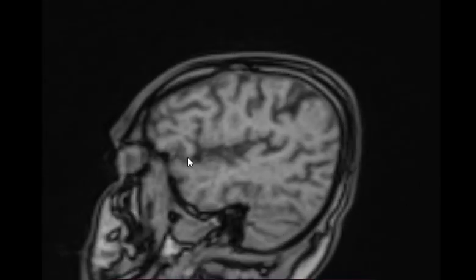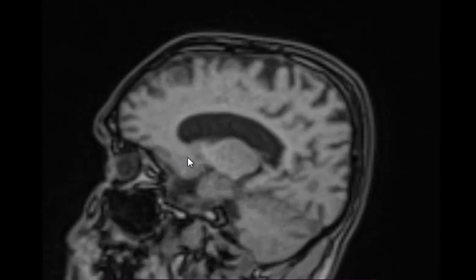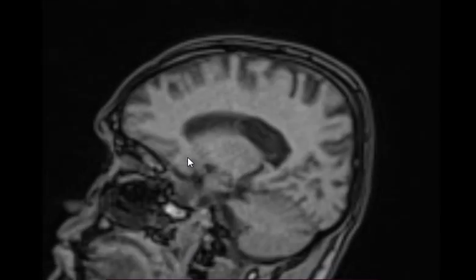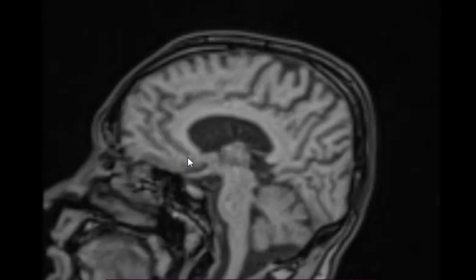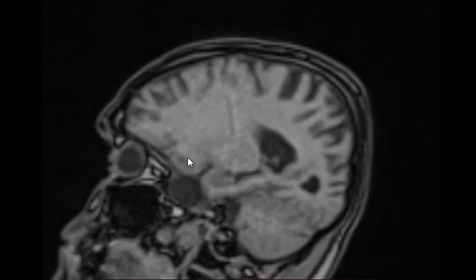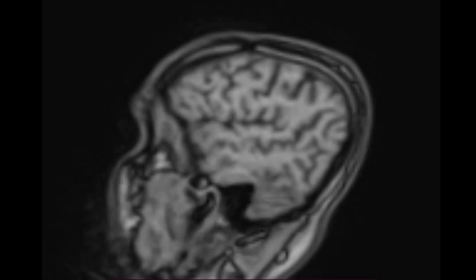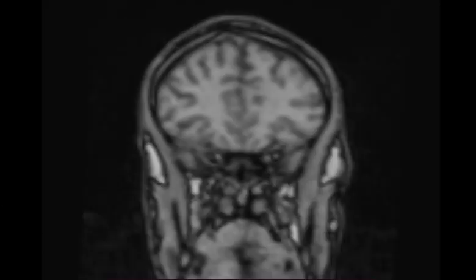So this is a brain MRI of a 28-year-old male patient presented with abnormal movements. Okay, so these are the images. Do what you like, you know how to use it. What's this sequence? This is scout, exactly. These are localizer images, scout, not real diagnostic quality images. All of these are scout.